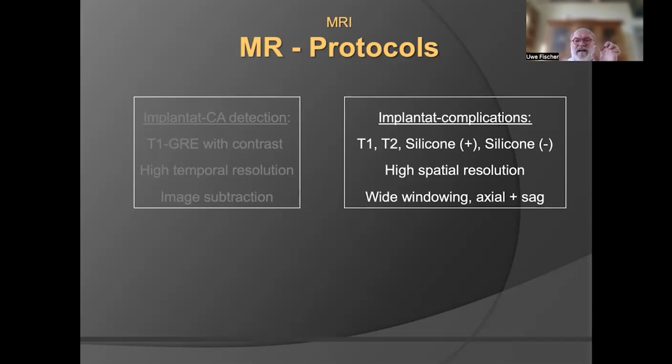I will show you later, the peak of silicon can be closed or can be opened. We have all the time of the world for the implants because there is no necessity to give any contrast material, and therefore we will get a high spatial resolution.